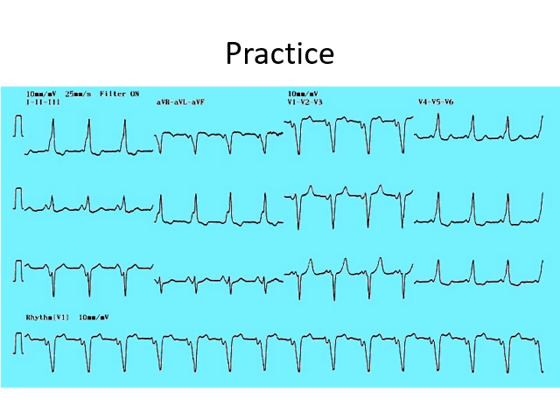Alright, let's mark P waves and PR intervals. This is a P wave and you can see that this is a PR interval which looks significantly shortened, and perhaps the initial part of QRS complex is slurred like this, which is also called as a delta wave.